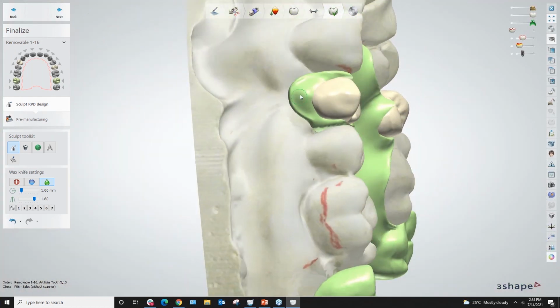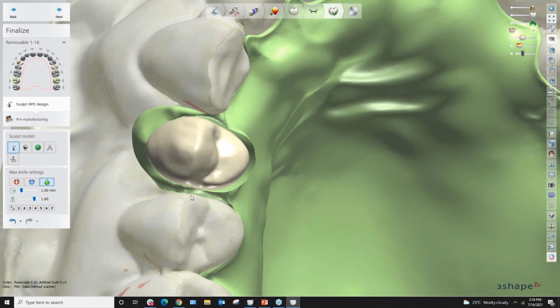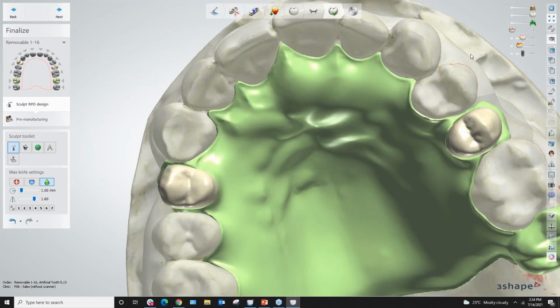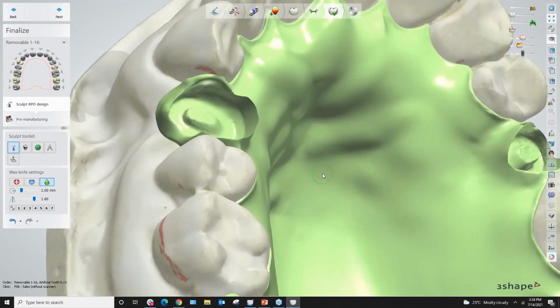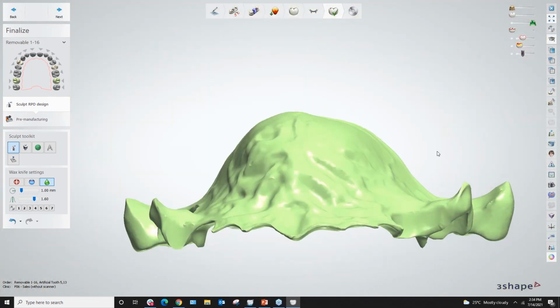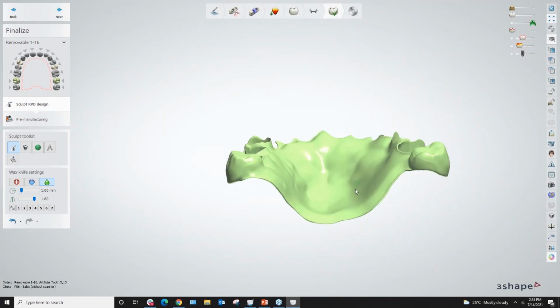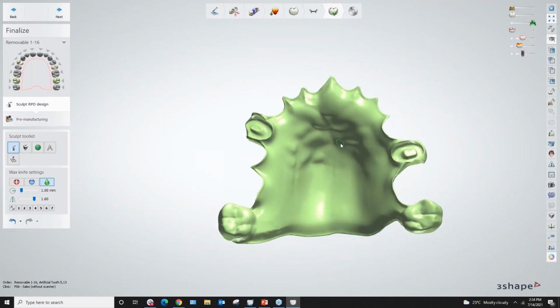Same thing on the other side. Remember, we did some exaggeration on the material itself. And like I mentioned a bit earlier on, my proximal contacts will be with the acetyl, which is the framework in itself. So if I cancel out these parts, I do have an acetyl base right here with my two posteriors incorporated and my two pockets created.